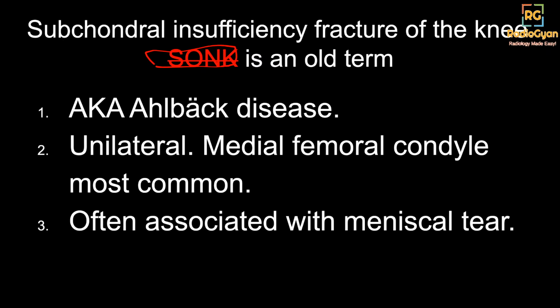The Society of Skeletal Radiology has come out and said that that's an old term and a misnomer, and we should stop using it, because it's not osteonecrosis, it's a subchondral fracture. So that's the preferred term, although some examiners may want that term, but the correct answer is subchondral insufficiency fracture of the knee. It's also known as Ahlbäck disease, it's commonly unilateral, and the medial femoral condyle is most commonly involved.